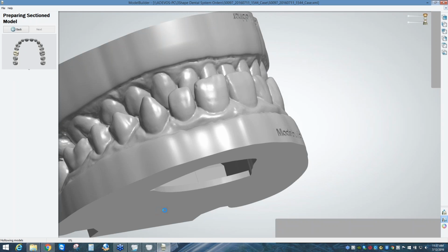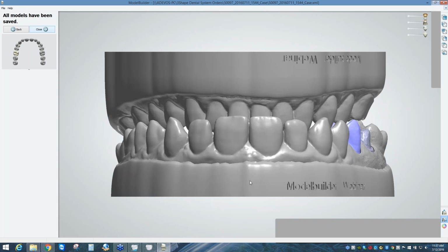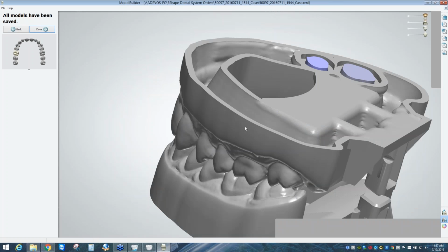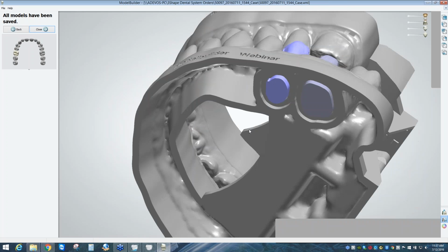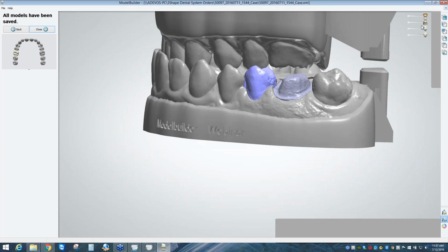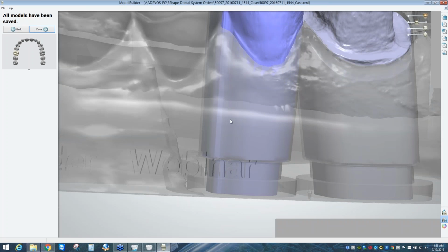So here it'll show us our final results for our shapes, and then when I close out, it should generate our STL files. Here I can see it's hollowed out our scans, and it's got our preps here if I turn off our prep model, with some spacing for the dies. So at this point, our model is complete, so I can close out.